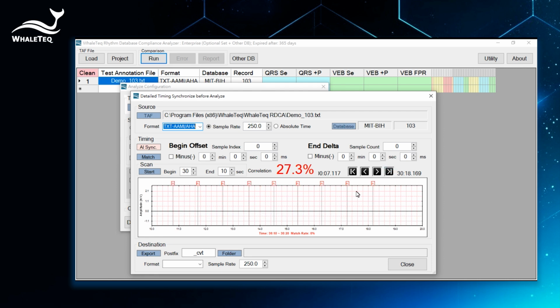Take a look at the end of the waveform. All labels are lowercase n. Rewind the waveform for a few seconds. You'll notice that the reference label has ended, but the algorithm label continues, indicating time shifts between each reference and algorithm label. The RDCA can correct these shifts.